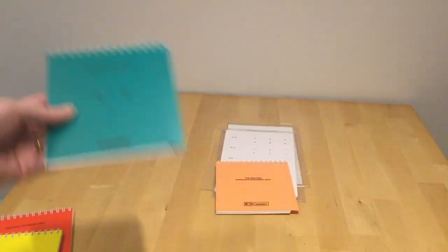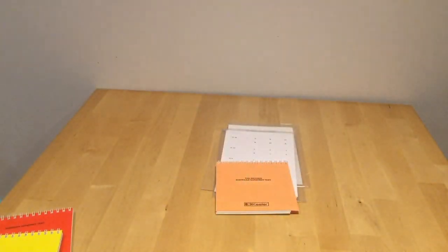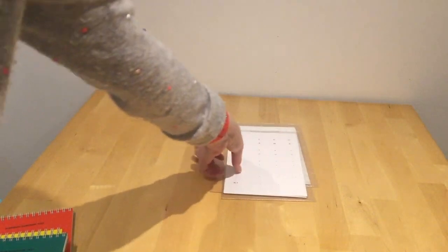But you can go further with the green book, 6/6 to 6/3. So a few more. There's 5 in here as well, and so on. But you'll notice it's a test of single symbols, 1 per page. So now let's have a look at revised Sheridan Gardner. It's actually very, very similar.